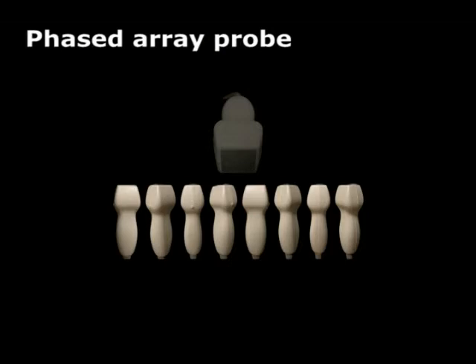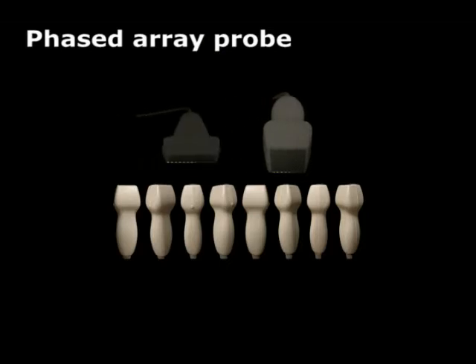Notice that this probe also has a flat top, yet do not confuse it with the high-frequency linear probe. The phased array probe head will be flat, yet more square in shape when compared to the flat rectangular head of the linear probe.